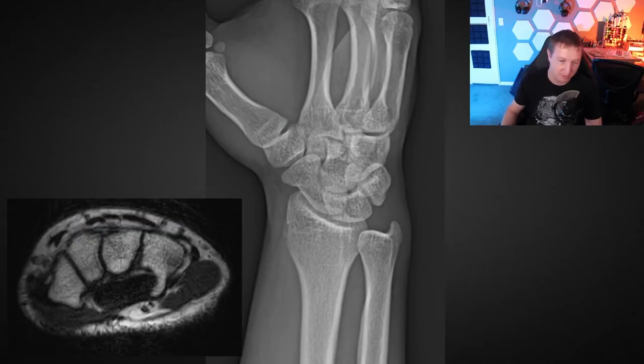perhaps. Oh, and look at this. We can actually see that little overhang at the physeal margin here. So very common to see that. And I often see, people who, when they first start looking at x-rays, they might think that's a fracture because it looks like cortical disruption. But as long as it's kind of continuous with a physeal scar there, we can be pretty confident that that's just normal for them.